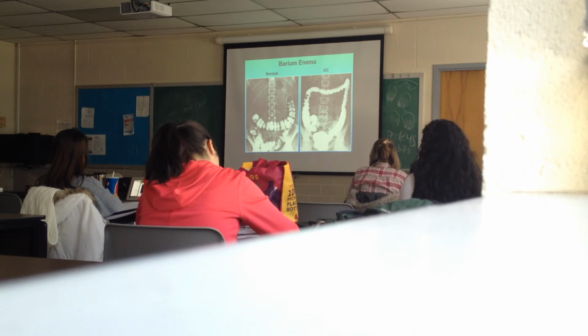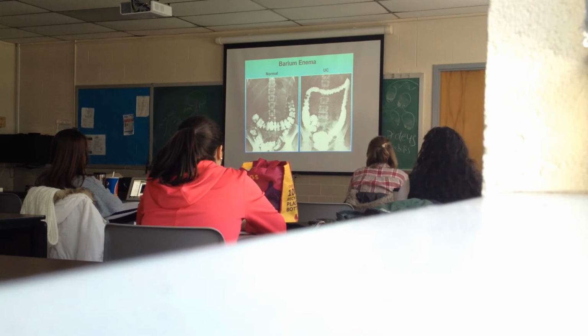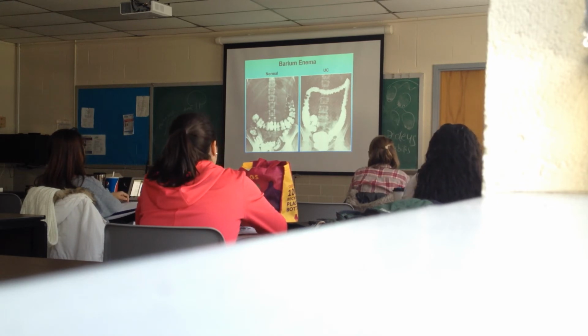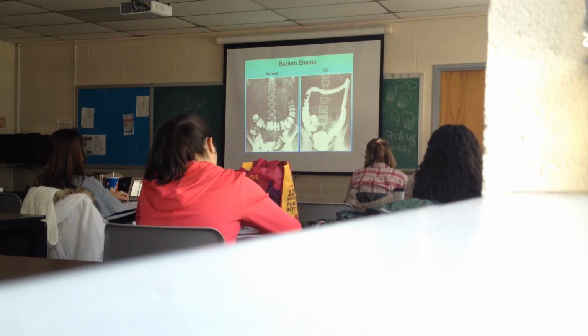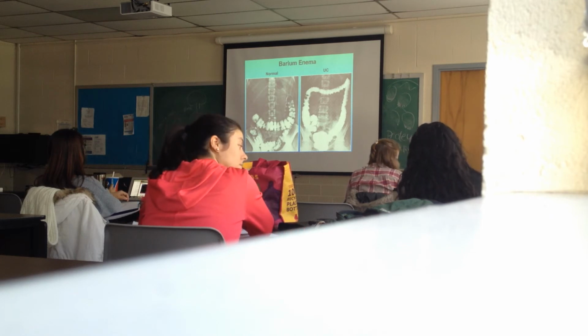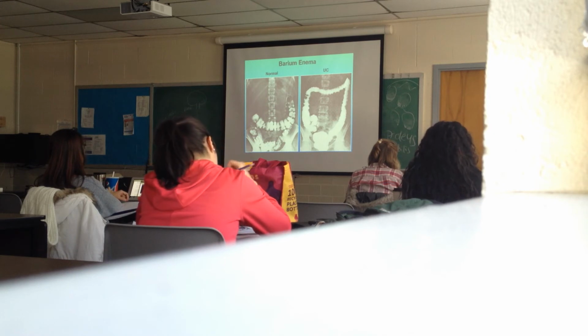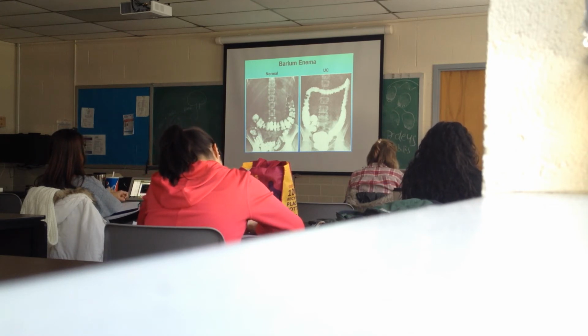Okay, so I pointed out, normally you've got a large bowel remarkable for haustra. Fluctuations in the caliber of the bowel are caused by the haustra. Nice, smooth luminal topography, and generally good caliber. Lots of slack, especially in the transverse colon. And you'd also see it in the sigmoid colon as well. Lots of slack in the sigmoid.